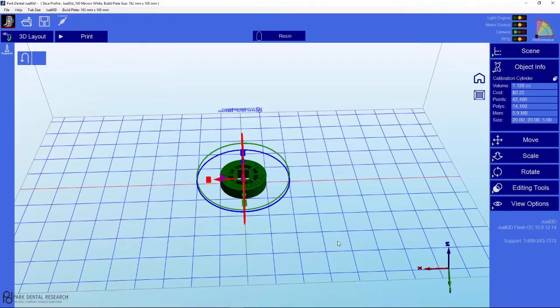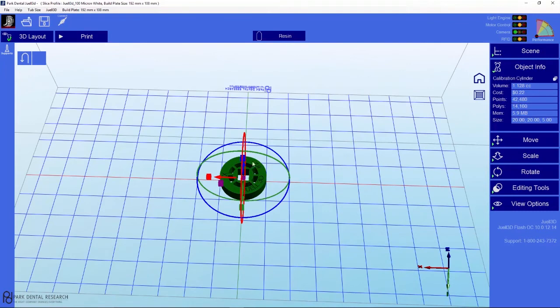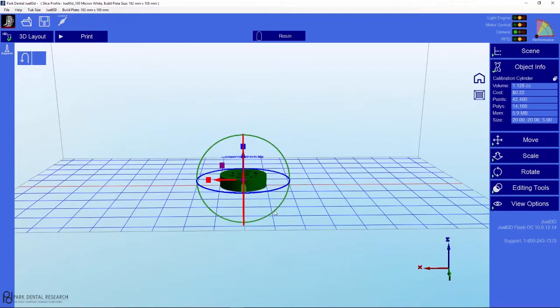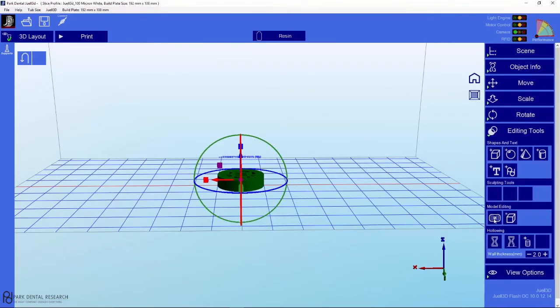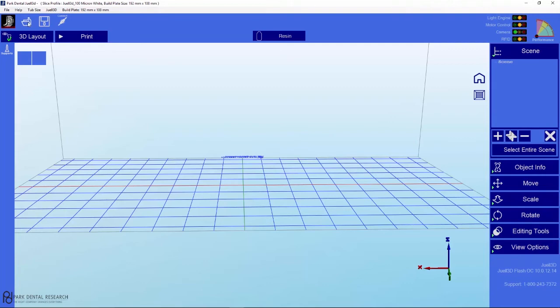So basically what it does is it reduces the number of cloud points in an object without reducing much of the integrity of the part and the points that you want to see. So that's kind of an interesting and valuable component to this. And on the very bottom row, we have our hollowing features. So that's significant. When you're printing models, you'd like to have uniformity in the size of the model.